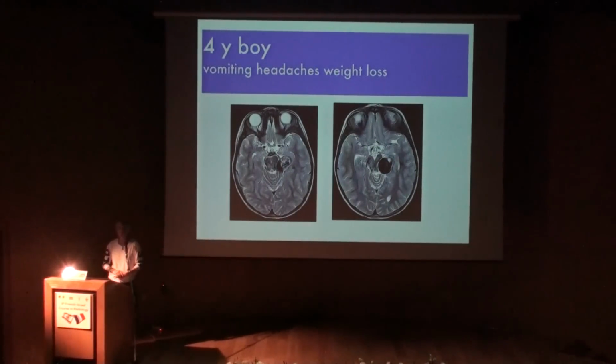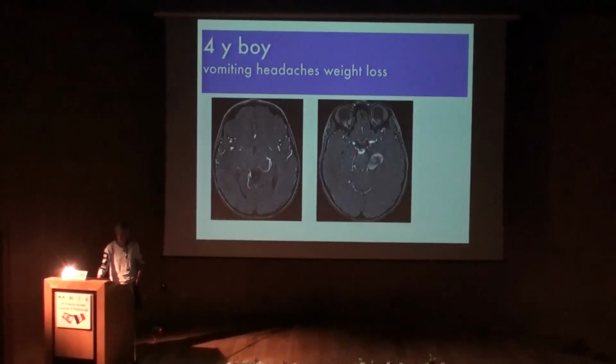This is a case from just a few weeks ago in our hospital. A 4-year-old boy presented to another system with severe headache and vomiting, but somehow they thought he was sick, and for a few weeks he was just complaining of headaches and losing weight, with no vomiting anymore. At some point he got an MRI that showed this huge, large, hypointense black cisternal lesion, which in my opinion is a signal void causing major pressure on the midbrain.